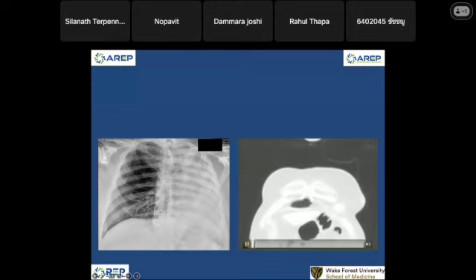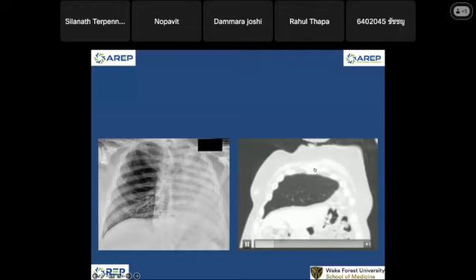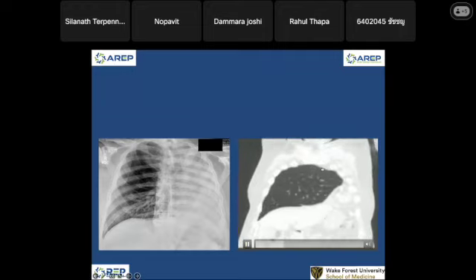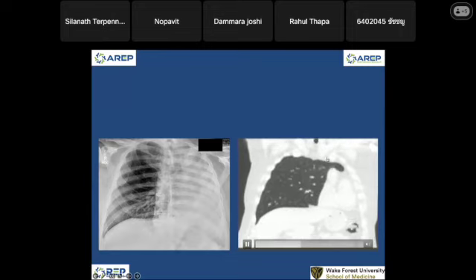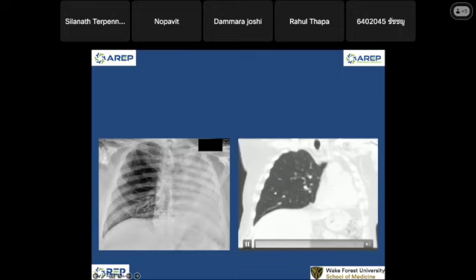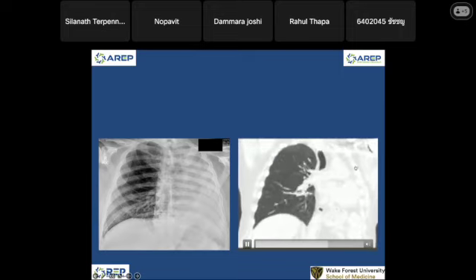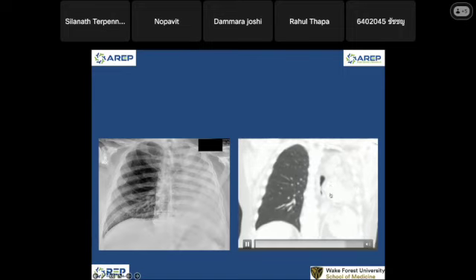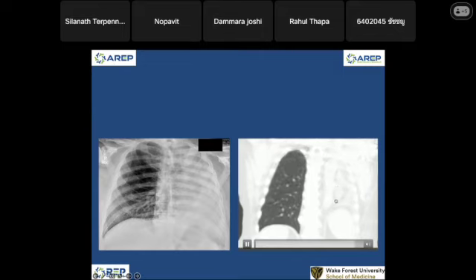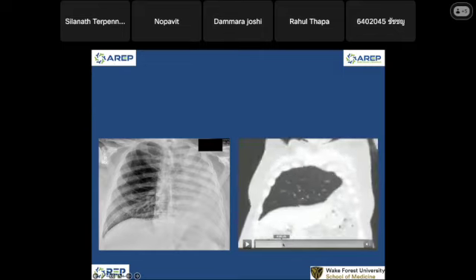Okay, this is our CT. This is our right lung. You see how it's very well expanded toward the midline, crosses the midline, and then goes to supply part of the left lung. And we don't even see left lung here. It's all gone. And the heart is here. So the heart, aorta, and great vessels are all in the left hemithorax. What's happening?